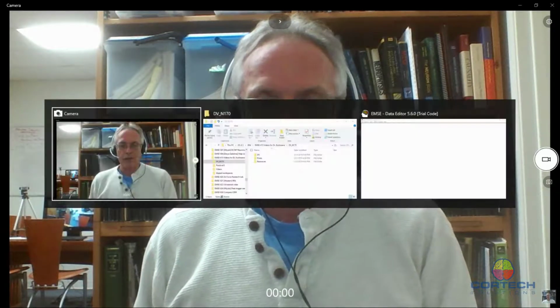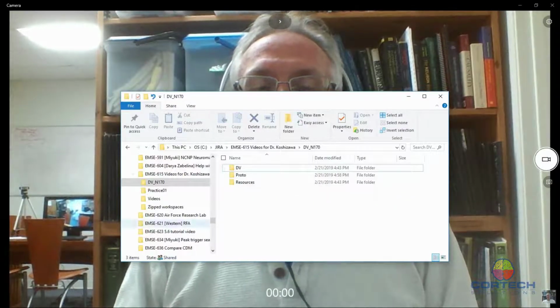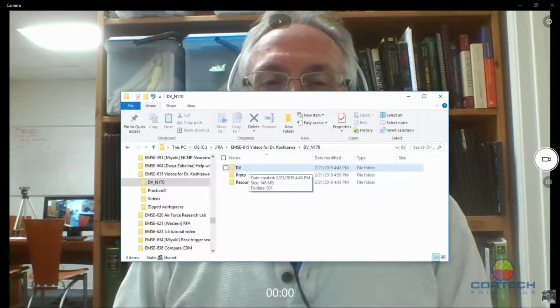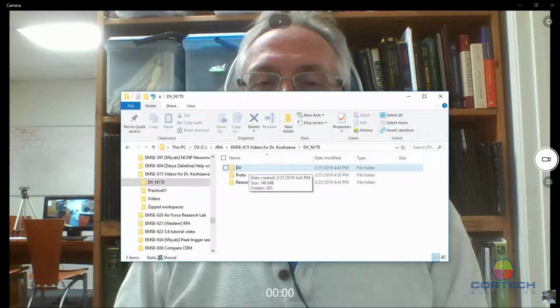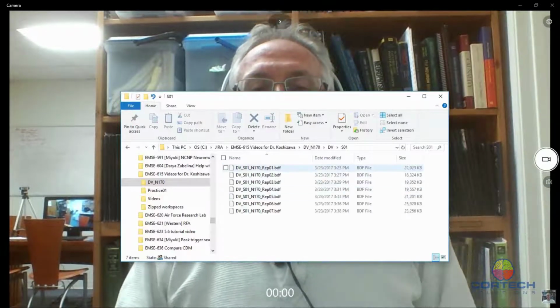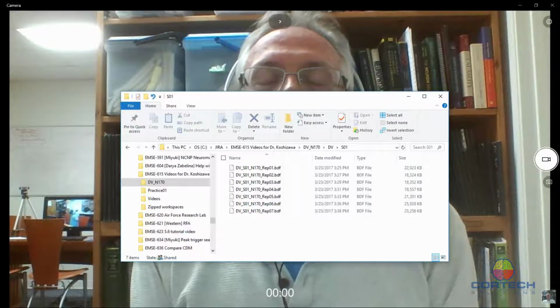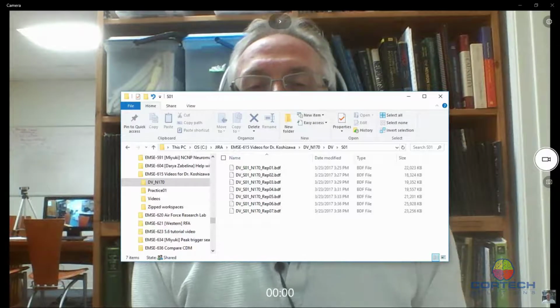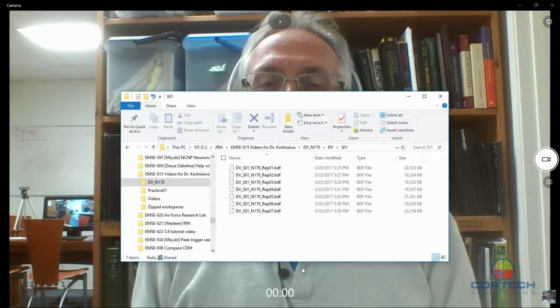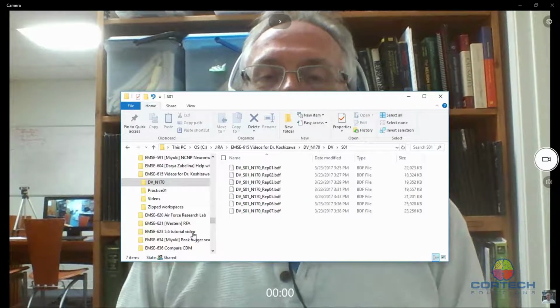So our data here that we'll be using, we're starting from a recording which is also on another video for our participant DV, Dimitri Boreatis. And in that live session recording, we had a session that created 7 replications of an N170 face perception task that came directly out of Neurobehavioral Systems Presentation, one of their standard ERP programs. Okay, so we used that.